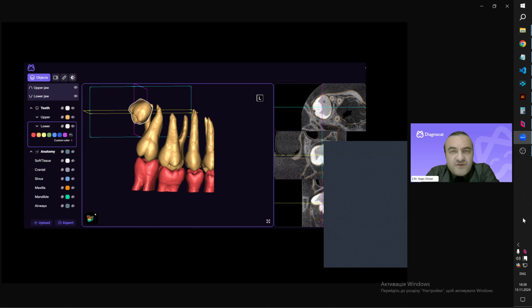Of course, I was showing you all the teeth for the adult patients, but we are using it for the deciduous teeth with the unerupted teeth as well. So see, this is how nicely segmented the third molar. Different kinds of AI algorithms can actually predict the unerupted tooth and can also give you, such as, the formation of the root, and you can also predict the age. You can use it as a forensic medicine tool in your daily practice as well.